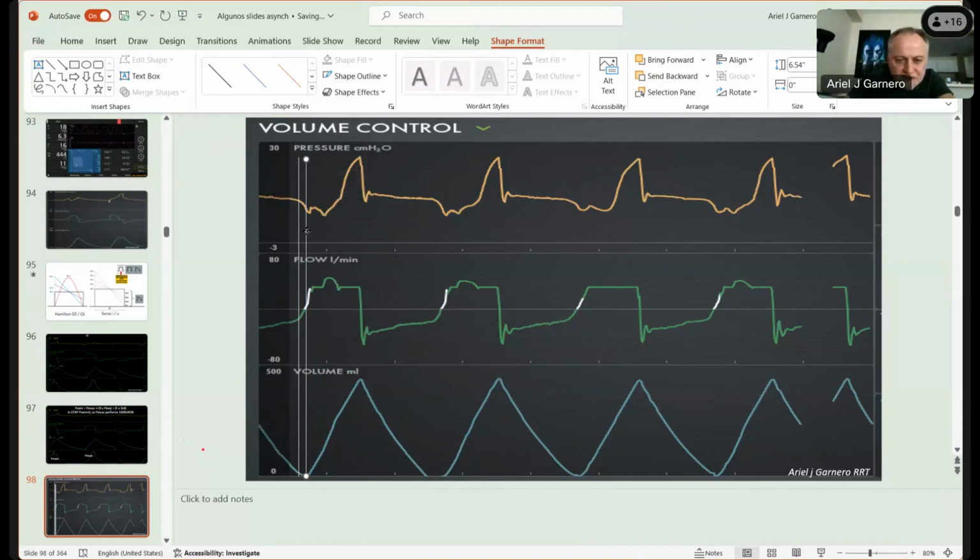So I'm drawing a line from the beginning of the inspiratory flow and from the deflection of the expiratory flow, which to me is related to an inspiratory effort. Right, it is. That's exactly right. So given that there is a delay between the patient's inspiratory effort, as indicated by the expiratory flow curve, and the start of inspiratory flow, you could argue on the one hand that that is a delay, a late trigger, right? So the ventilator responds after the patient.